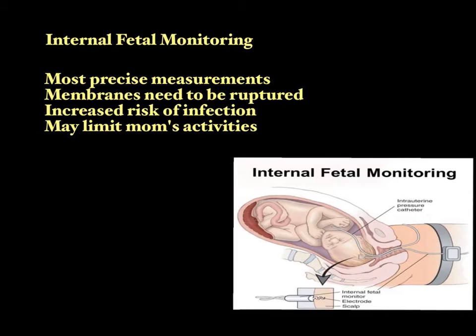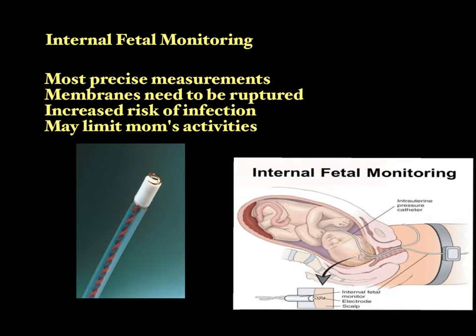and put it up. Give me 1 minute. Okay, there it is. And let me just show you that little arrow. Here it is. That's what gets screwed into the baby's scalp. This plastic tube here gets withdrawn. It's just sort of a guide so that you can get that wire and that electrode in, and then you kind of screw in the wire and the stylet comes out, that little plastic tube comes out.